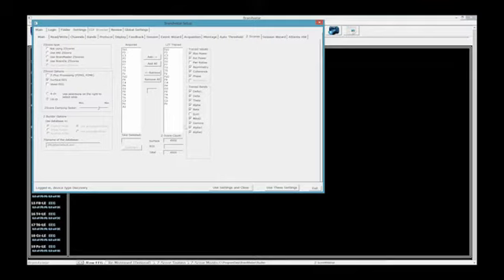But with both BrainDx and ANI, what you're going to notice is sometimes a lot of additional bands, which are convenient because they can take a band and break it down into different components. For example, alpha 1 in BrainDx is 7.7 to 9.7, and alpha 2 is 9.7 to 12.2, I believe.